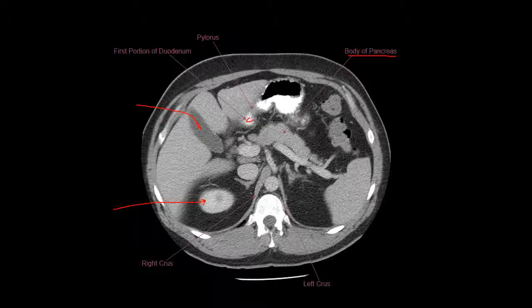Well, we keep scanning down lower, right? And we saw an adrenal gland earlier. If we're below the adrenal gland, that is your right kidney. Okay? Left kidney is not in view yet because left kidney sits a little bit lower than the right kidney. So we'll get to that in a minute. Again, a note, here's your splenic artery running across. Okay?